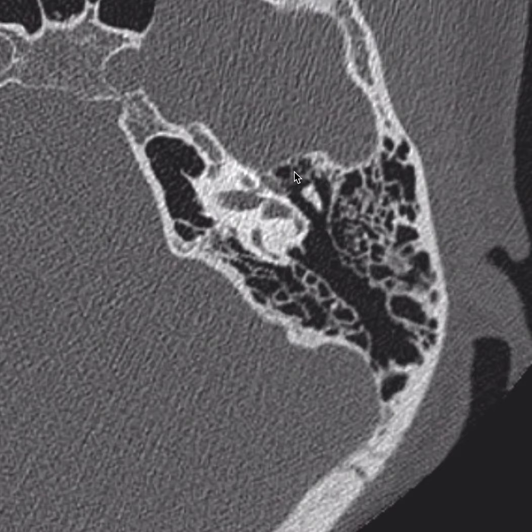Also, if you get a cholesteatoma here, it can cause impingement of the facial nerve. Medially, we'll notice the facial nerve is passing right next to it. Here's the geniculate ganglion, and here is the tympanic portion of the facial nerve coursing posterolaterally right here.